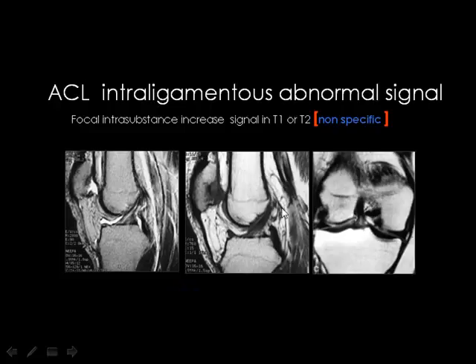Then, if you look at this ligament, what do you think? Is it normal or abnormal? This one looks normal, okay? The ligament is stretched and is okay. Then we accept in the ACL, if it is stretched, we accept linear shadows of abnormal signal. This is considered normal. Once you see the ligament is stretched and is of normal caliber, not swollen, then you consider the linear shadows within the ligament as normal findings.